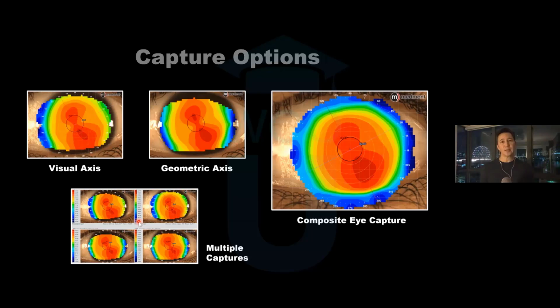That's one of the things. And then the second thing is, do one of the maps show a slightly smaller fissure than the others? Or does one of the maps seem to have some erroneous data? So do we throw that one out and keep the best one, the one that has the most coverage, has the smoothest contours?